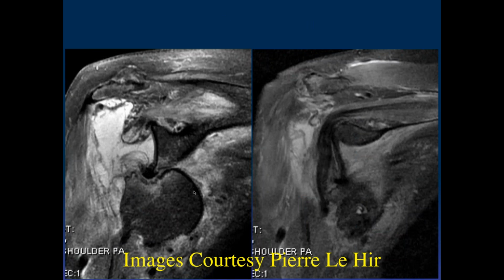Normal or abnormal, Sam? Abnormal. Good. Looks like in the last few, I guess, just before it relocated. Slightly abnormal or big time abnormal? Painfully abnormal. How they got this person to get a scanner, I don't know.